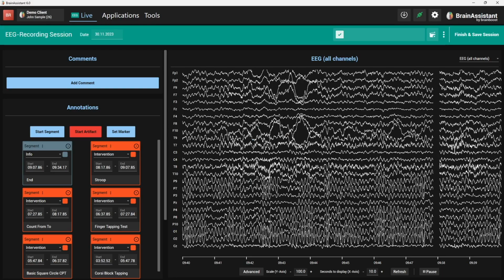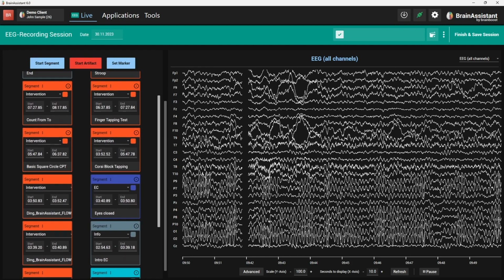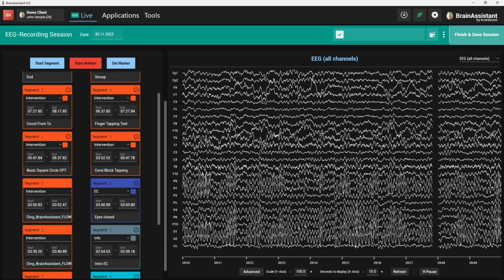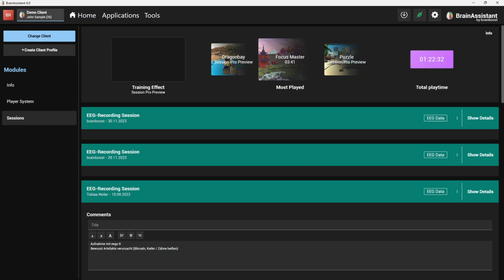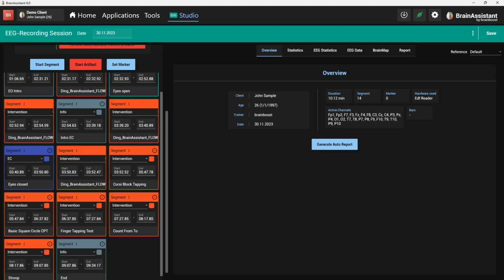Close. And now we see here, we have everything documented automatically, even here at the end. So everything is documented. Let's say finish and save session. Okay. And as you're used to from the last webinar, you just click on the client now, and here we see recording session. This was yesterday, my German webinar. Let's say show details. And now we have all these segments.